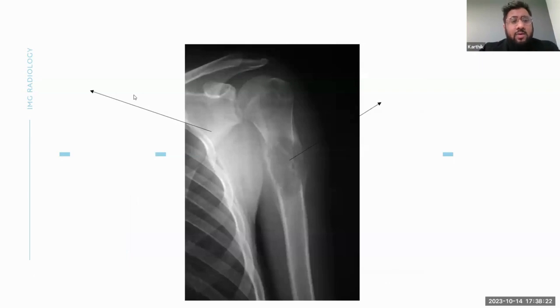Okay, guys, it's one of my favorite X-rays. Can you guys try and guess what's going on here in the chat? I'll give you a few seconds. Some very good guesses going on there.